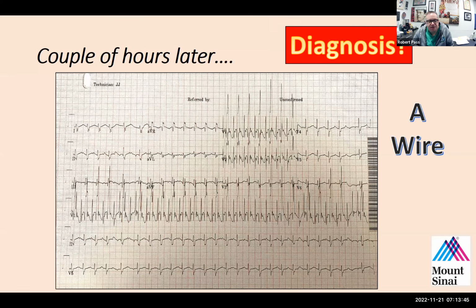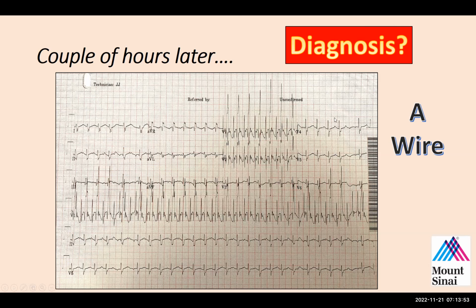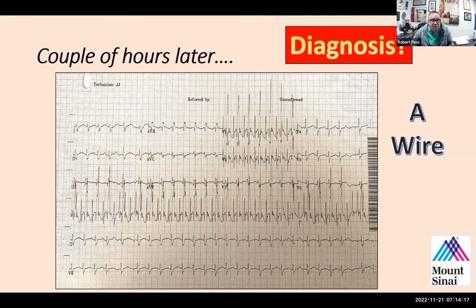At the very end of this tracing, I'll point it out over here. There is a gift that's been given to us. Yeah, so there's definitely, we see 3 atrial depolarizations and then just 1 ventricular. So what is the atrial rate? Atrial rate here is 1, 2, 3, 4. It's 300 probably. It's very fast.